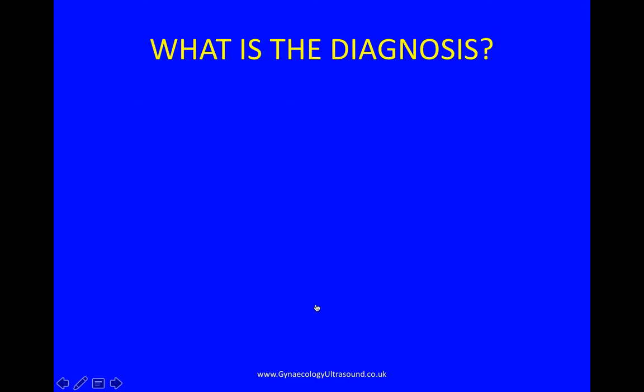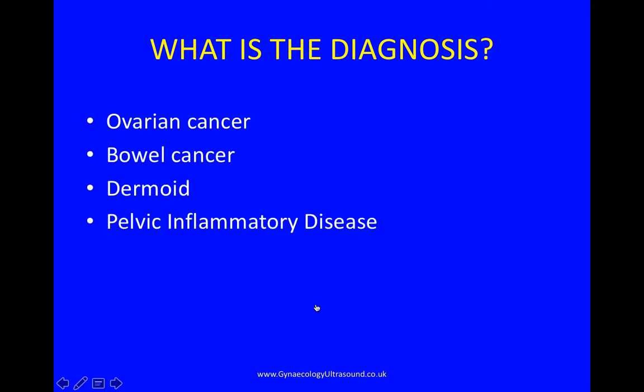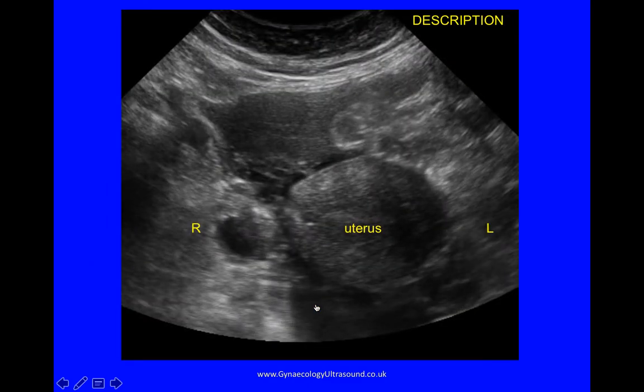What's the diagnosis? Is it ovarian cancer, bowel cancer, a dermoid, pelvic inflammatory disease, or pseudomyxoma peritonei? Let's look at the images together.